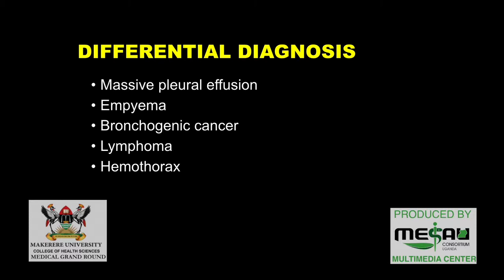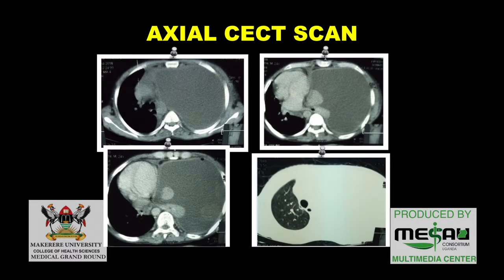We cannot rule out lung collapse or lung tissue pathology because we cannot appreciate it on this radiograph. And the patient further went and they did a contrasted CT scan. These are some of the images.